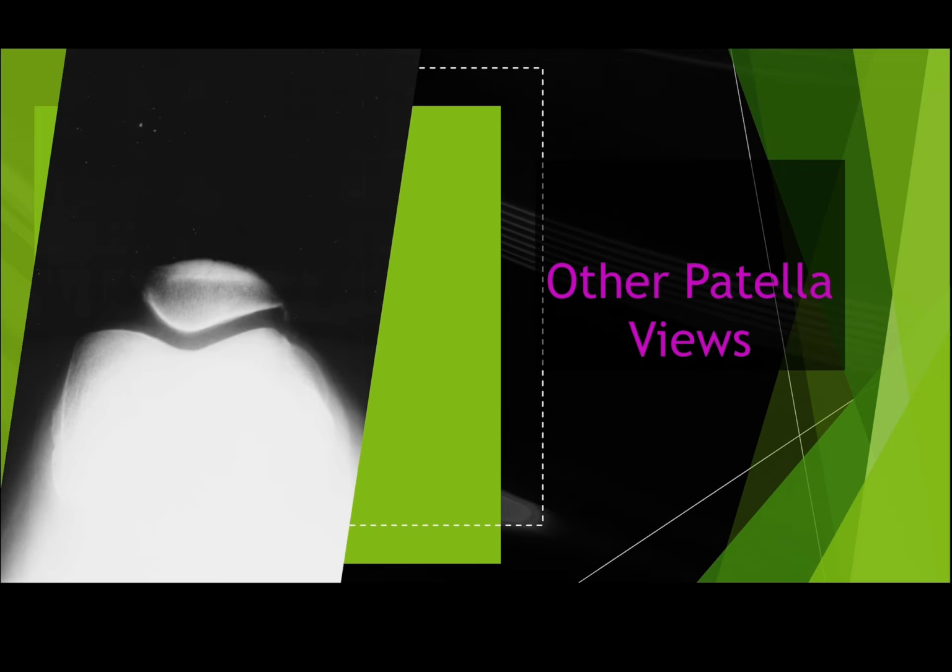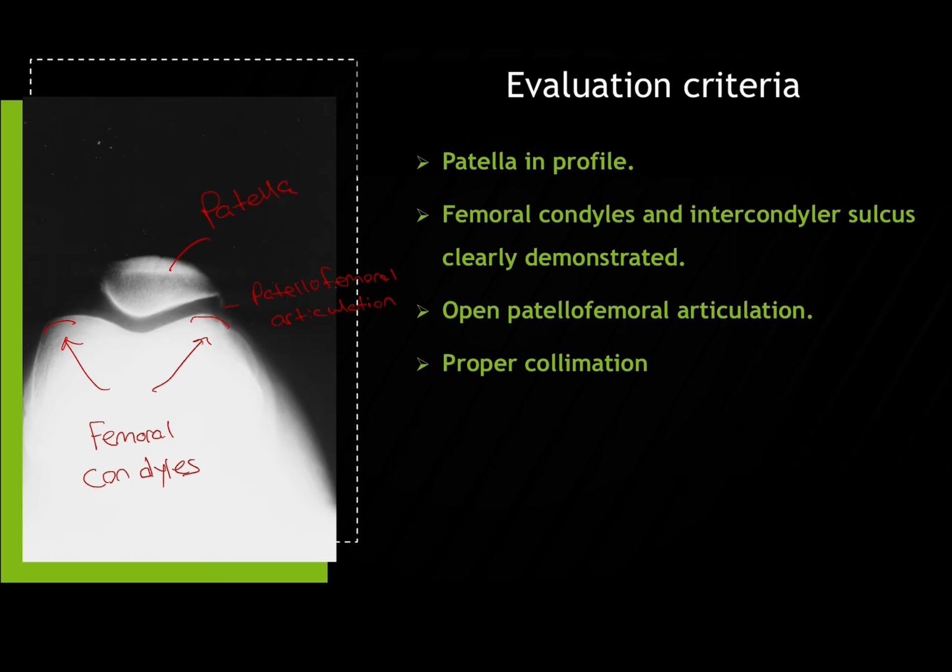So here are some of our other patella views. First, we'll start with the evaluation criteria. The patella is in profile. Femoral condyles and intercondylar sulcus clearly demonstrated. Open patellofemoral articulation. Proper collimation. So we want nice tight collimation when we do this. We want that patella to really stick out, and we want that nice clean open joint space.